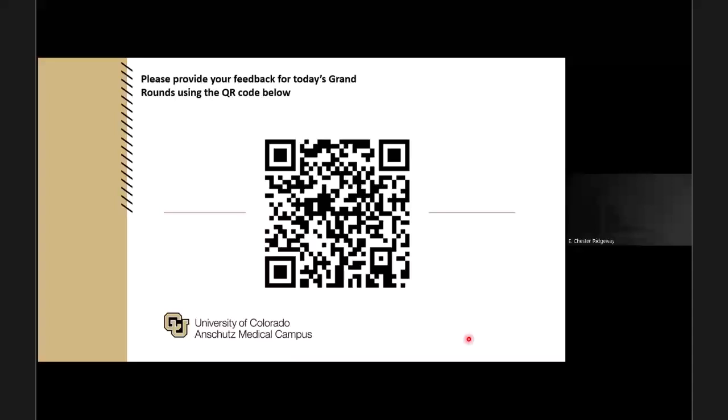Don't worry about it. No, I don't even use it as a radiologist. So what it does is it's an AI-generated image, essentially subtracting the bones. The thought behind it is that it makes it easier to identify parenchymal processes. One of the caveats of looking at x-rays is the ends of ribs overlie the chest where the lungs are, and sometimes those can be mistaken for masses or nodules. Sometimes it's hard to say.